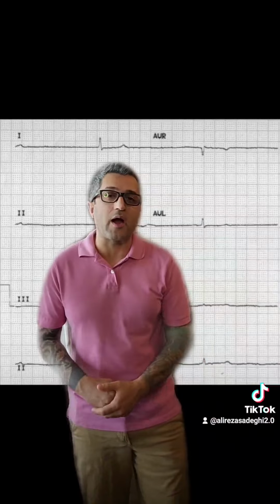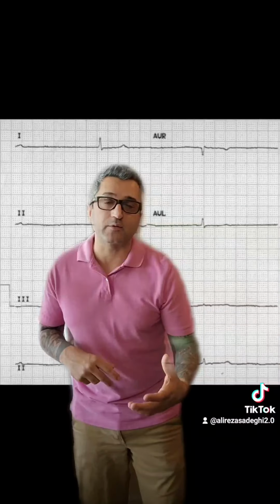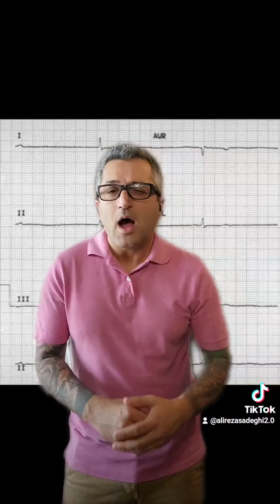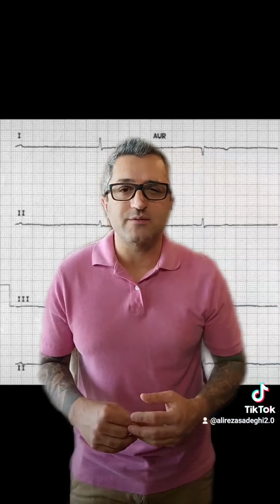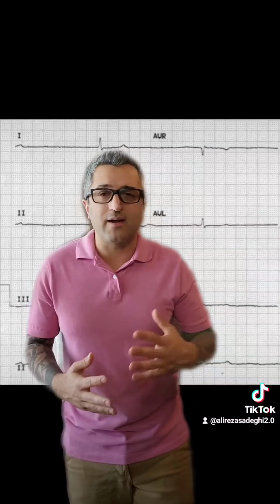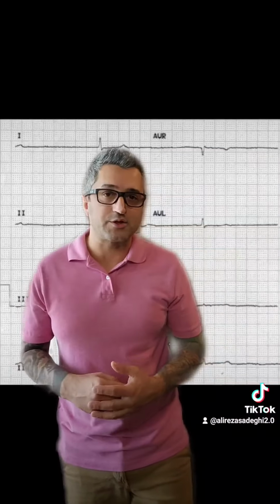Hypo and hyperthyroidism affect the metabolic rate as well as the cardiac muscle's contractility. Hyperthyroidism EKG changes are late and usually pretty unremarkable. You can expect to see sinus tachycardia or atrial fibrillation.